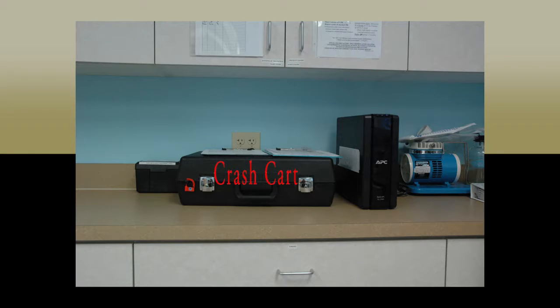The right side of the counter houses the crash cart, a black suitcase that contains all necessary equipment and medications in case of a medical emergency or code. The physician will be charged with this equipment if it's ever used.